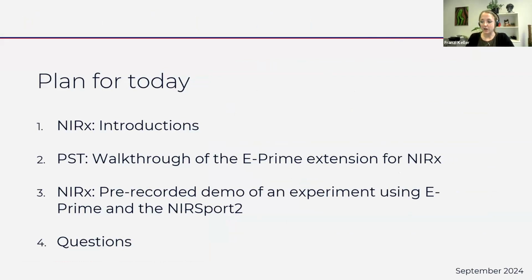Next, my colleagues from PST are going to take over and present you with a walkthrough of the ePrime extension for NIRx, and they're going to click through the software with you. Afterwards, we're going to show a pre-recorded demo of a real experiment using a pre-programmed script in ePrime, as well as our NIRsport 2 with our Aurora software. And then lastly, as I said, we're going to address any questions you might have.